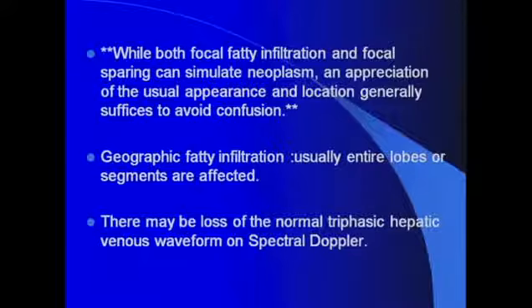Now, in fatty liver infiltration, you may lose a component of this, or you may lose two components, and the waveform becomes flat monophasic, or sometimes it may just be biphasic, which also should raise the suspicion for fatty infiltration.